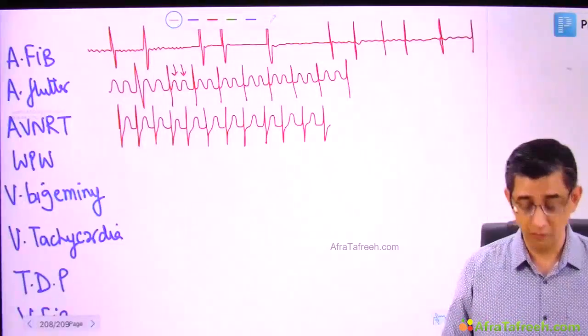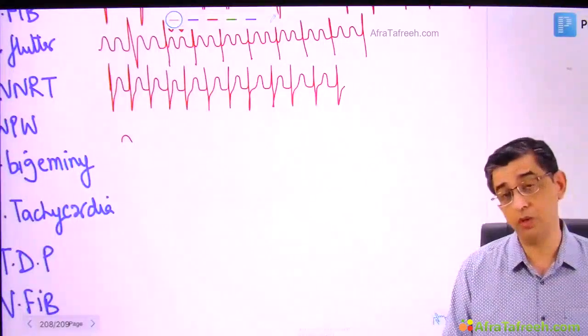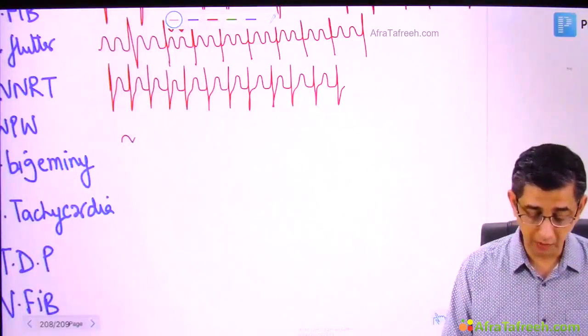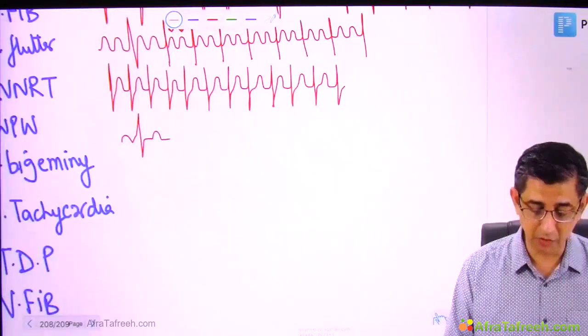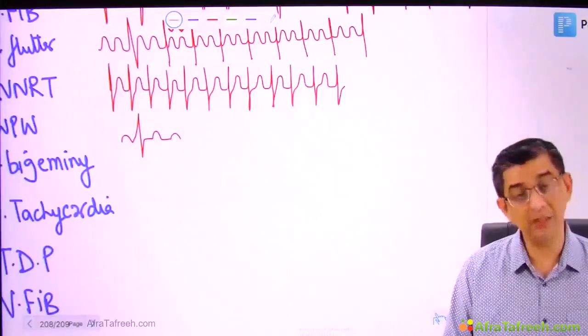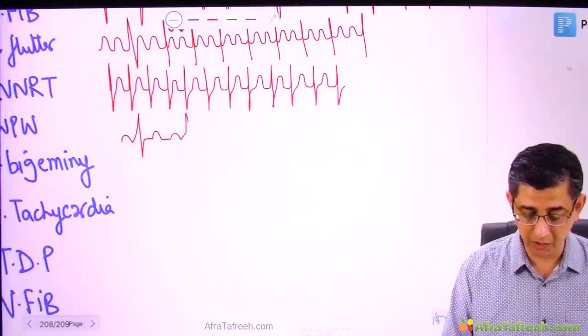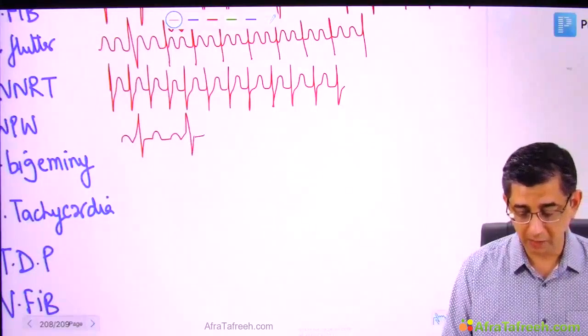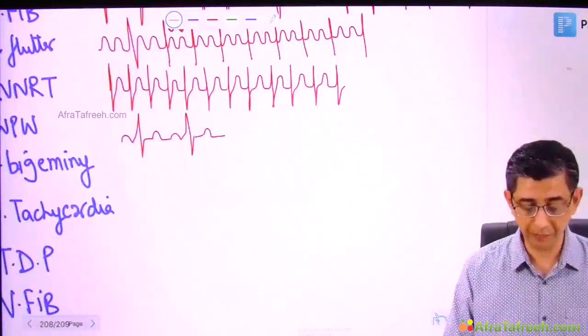When it comes to WPW in a patient, the moment the P wave will finish, you will notice there would be no Q wave. Then there will be a presence of a delta wave that will be easy to decipher because of change of the slope. The highlight is exactly when the P will finish, you will notice this upswing, change in the upswing rather, and a delta wave present. And along with that, obviously, family history is given. It's all the more welcome.